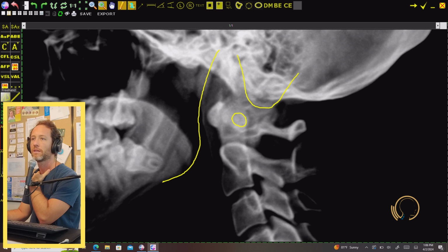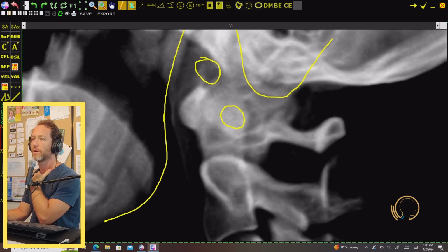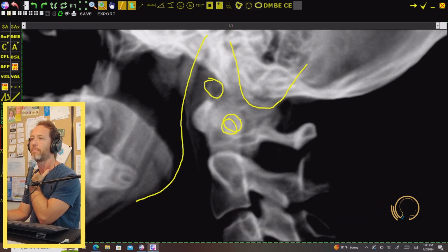If I'm up here, we've got a problem. And even if you're close, right? Even if you took some of that measuring that we just did and you were slightly off, maybe you missed it and you picked the anterior and slightly low one, you're still light years better off than just shooting in the tragus notch. Does that make sense? All right.